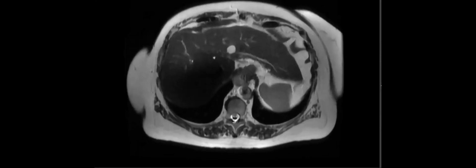But it's super bright on T2, is that reassuring that it is benign? Cholangio won't be that bright. We've seen some cases in this conference where it's been really bright. Okay. I guess if it's not a typical hemangioma on the other phases, I don't think you can. I think you still have to call it LRM. What do you guys think? I agree with you. I called it LRM.